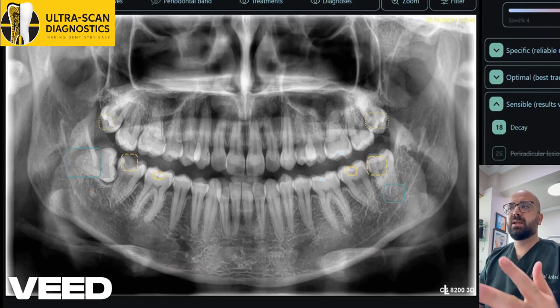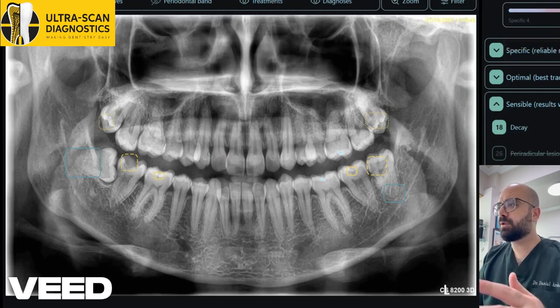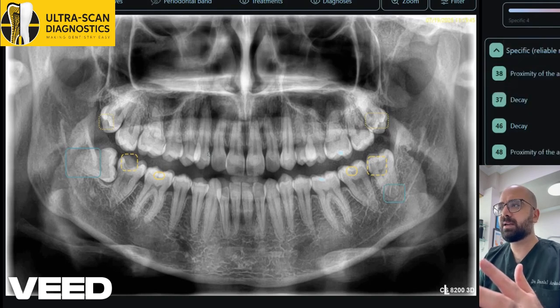But the good thing is, specifically speaking, the AI detected 4 absolutely specific things which it thought it was completely correct about, and those were the 4 specific things that the AI thought it had seen.